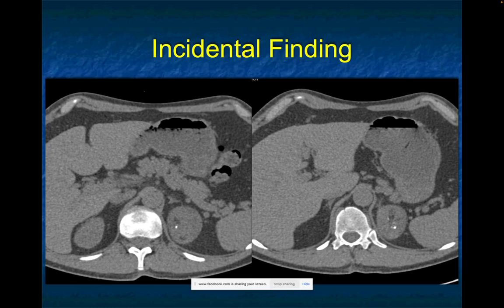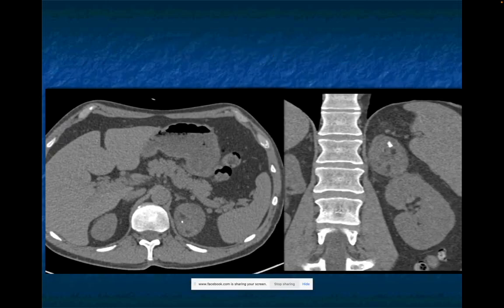It has fat and calcification. To me, when you have fat, I'm thinking myelolipoma. Myelolipomas can be 100% fat or minimal fat. When I see calcifications that are punctate and I see fat, to me that's a really good call for myelolipoma.